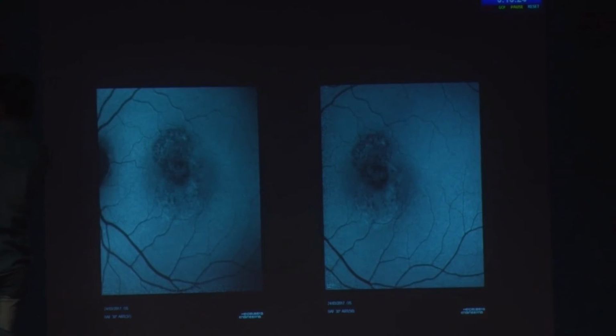What I found was quite scary with that is that Dr. Manoj in fact showed that case with those red dots. And so I have in fact a question for you. When you see those red dots, you must be very careful because you always think of hemorrhages when you see red. And actually, when you see the actual color photo, you see it's actually black pigmentation. So I always get puzzled when I get only a Heidelberg photo done. Are we doing justice to this patient, or should we also get a flash photography?